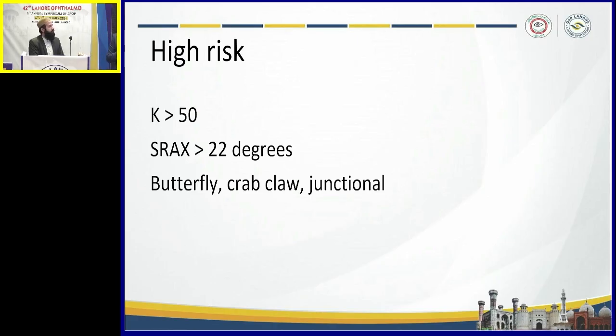There's another thing that I forgot to mention that you can do if you want to see if this is an alignment issue, just as a very quick thing.